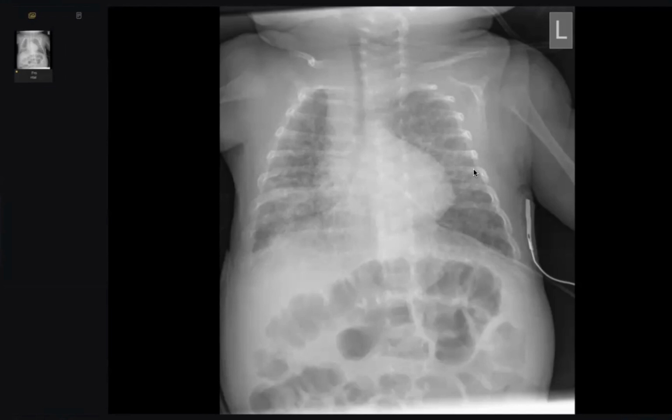No, doctor, you were incorrect. I told you this is two months later. The volume is reduced, and in emphysema the volume is increased. Second, the most predominant process is fibrosis, whereas in emphysema there are strand-like or bubble-like lucencies. Okay, so what is your diagnosis? It is respiratory distress syndrome complicated by bronchopulmonary dysplasia.